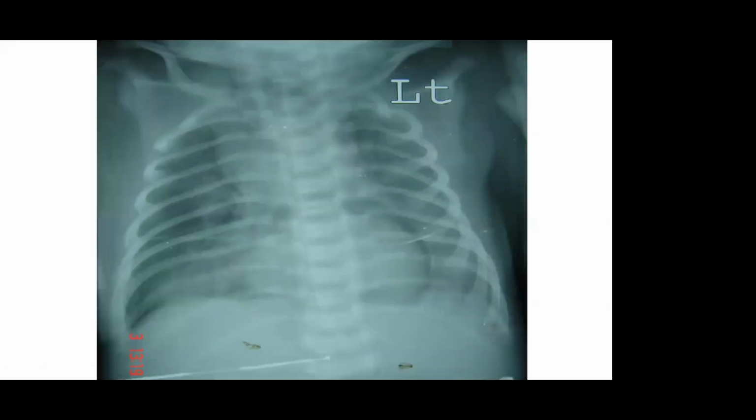This is more or less pneumopericardium, and maybe some amount of pneumomediastinum, because around the thymus we can see a small black line which is a little different from the right lung field. So it could be pneumomediastinum coexisting with it.